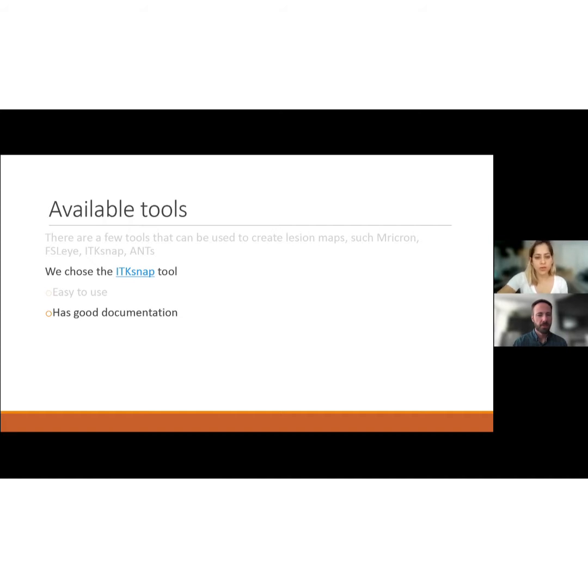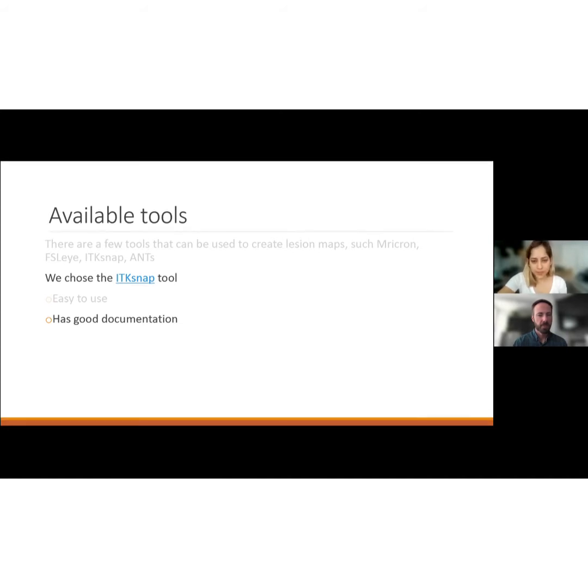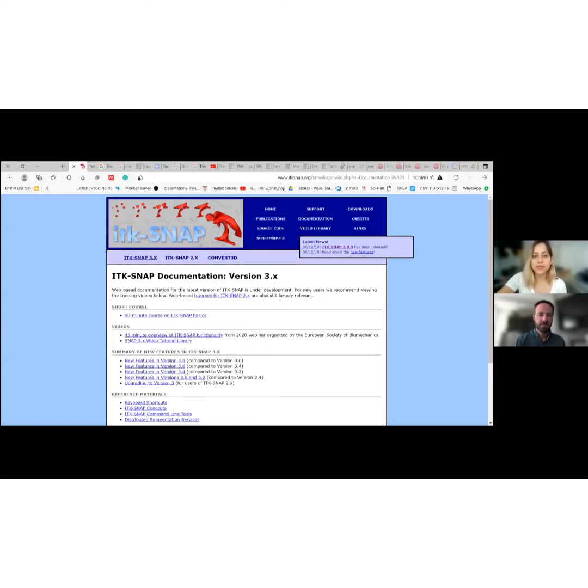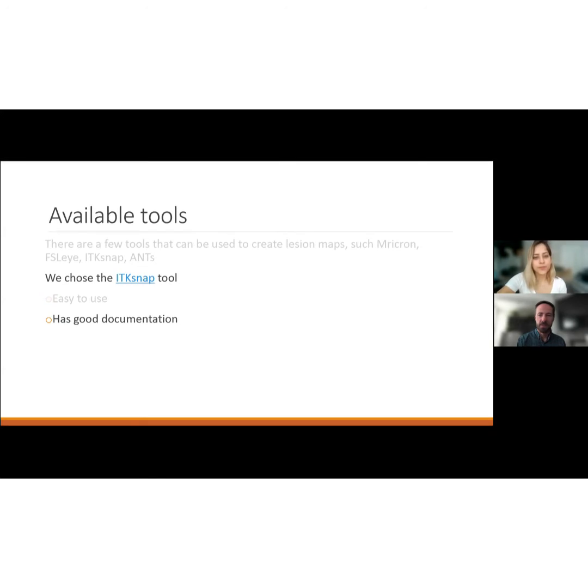So if I go to their website here, you can see there is documentation. It's very well explained. There are many videos that you can find on it. There is a 90-minute brief tutorial about how to use the tool, and so this is a good reason for using it. And let me go back to the slides.